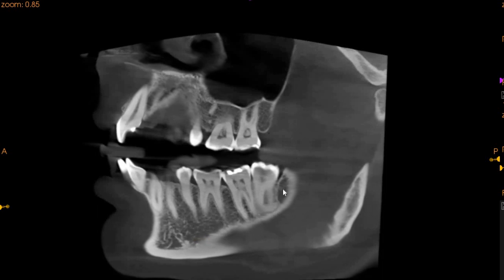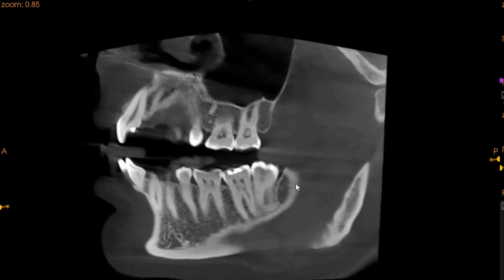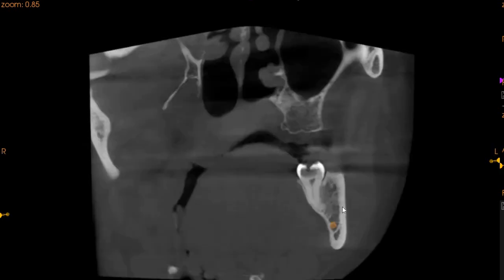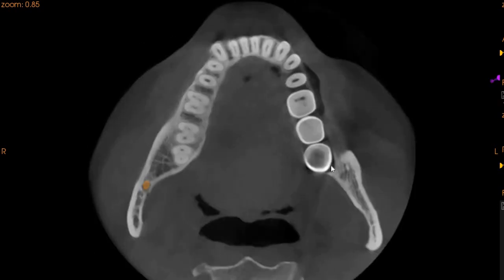So extracting this wisdom tooth, these are the points that the surgeon needs to keep in mind, that it is looping around bone. Both the roots are fused with the bone in the center, and there is a huge distal curvature of the root at the apex, with a slight dilaceration. Here you can see that it is also very curved at this point as well. The crown structure is grossly carious, and there is a risk for the tooth to break as well.